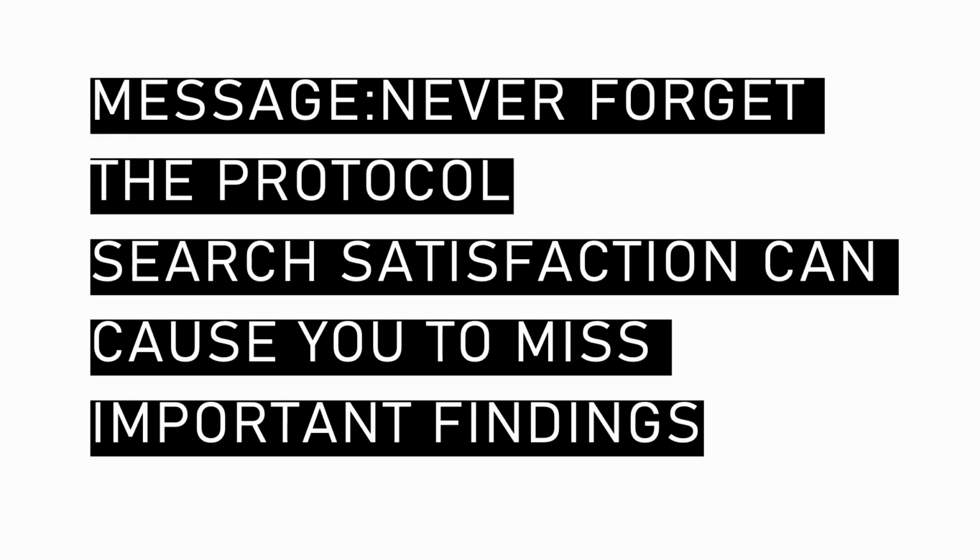So the message for this case is never forget your protocol. Even if you find a big finding earlier on in the scan, continue with your protocol so that you don't miss out any other subtle findings or more important findings in a case.